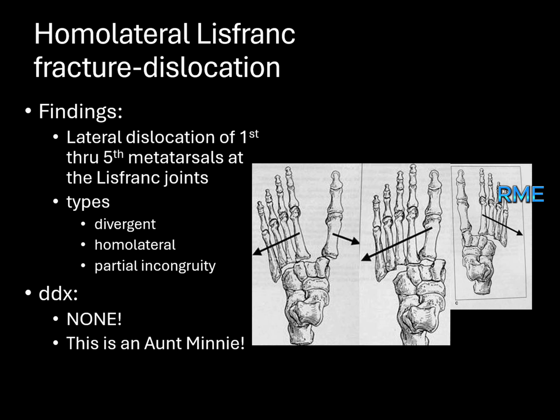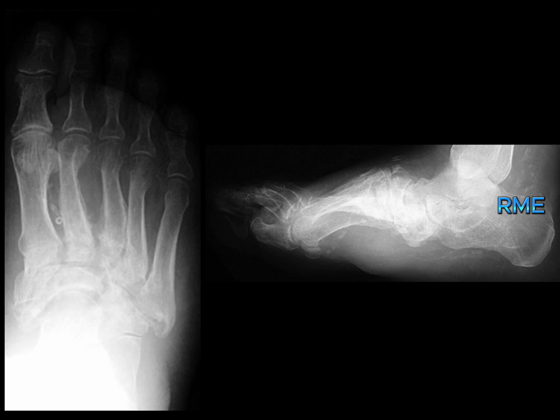To further evaluate, weight-bearing radiographs or a CT scan can provide a better assessment of the Lisfranc injury. Management typically involves surgical fixation to stabilize the dislocated joints. Let's move to the next case.